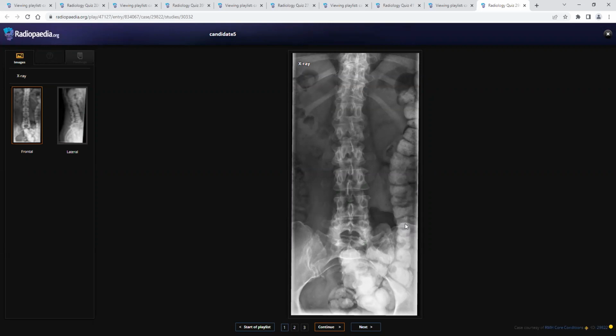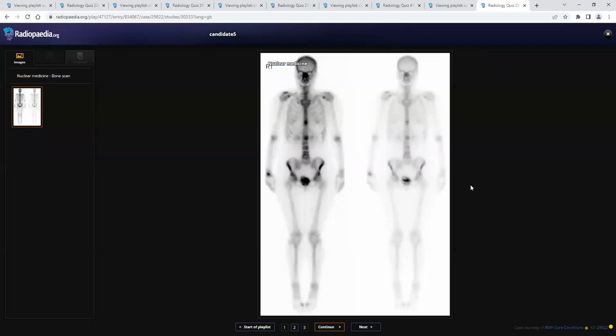But the clinician is suspecting something is going on with the patient, and they proceeded with the bone scan. In the bone scan, I can see multiple areas of uptake throughout the spine, in particular the lumbar and the thoracic spine. They are very focal.